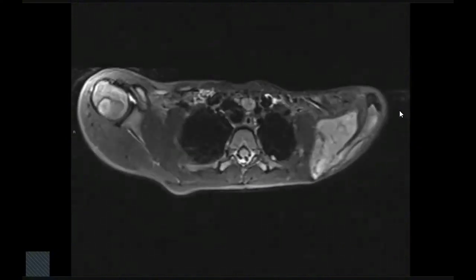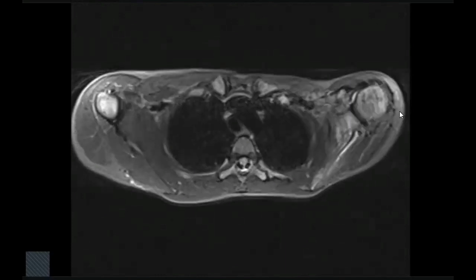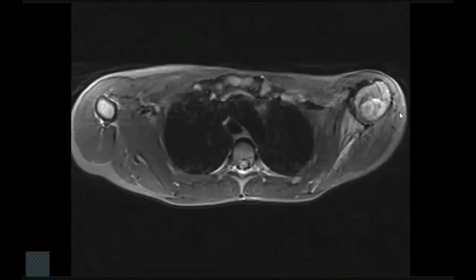These findings likely represent a neoplastic mass lesion such as osteosarcoma. I will immediately refer these findings to the regional sarcoma center for further biopsy and management of this case. And a CT scan of the chest should be done to see any metastatic disease in the lungs.